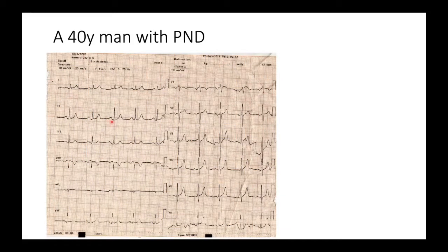And the third criterion to tell that there is a left atrial enlargement is you have to see the two peaks of the P wave, if you are able to see them, and the duration between the two peaks of the P wave is around 0.04 seconds. So these three things tell that there will be a left atrial enlargement. These are a few of the criteria. Then we also have something known as the Morris index and the Macruz index. I'll discuss them in the further slides.